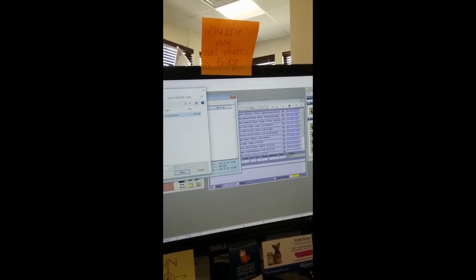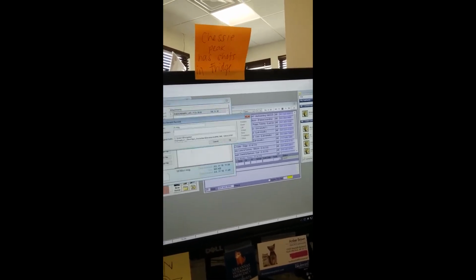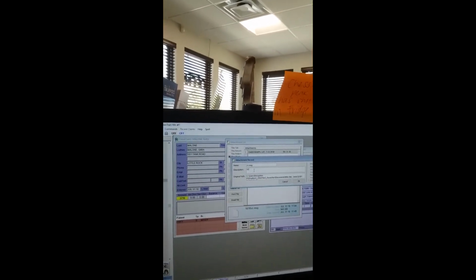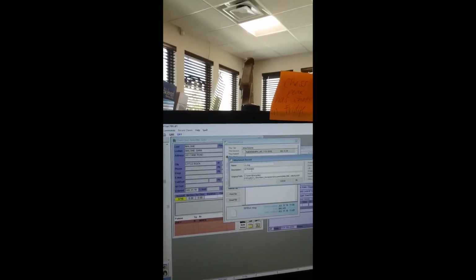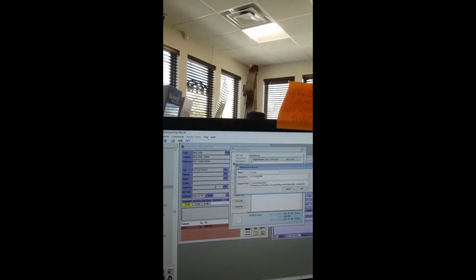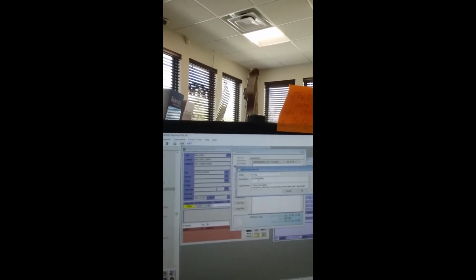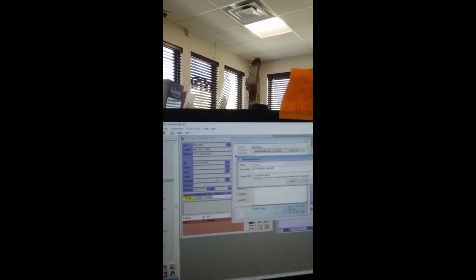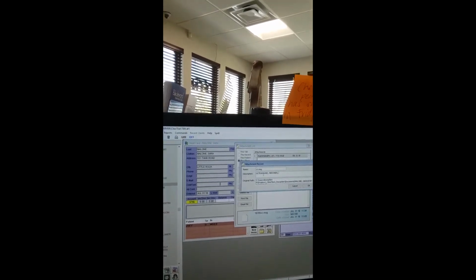I'm just going to use this, but I'm going to call it, let's just say ultrasound. And probably, let's say, abdomen. And the date.